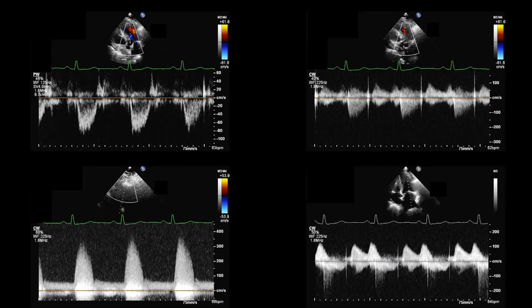And if we examine the spectral Doppler again, we can see that from the apical window, the transvalvular gradient is actually quite low, with no significant stenosis, and this is in agreement with the 2D pictures. So the unusual aspect is the high velocity obtained from the suprasternal window. Now, what could account for that?